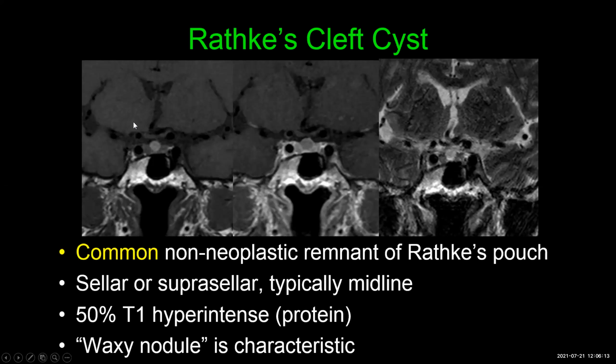This is a pre-contrast image. We might think that this is the posterior pituitary gland because it's this little bright spot, but we are actually more anterior than would be expected. This little round thing is sort of bright without contrast. If you just looked at this post-contrast image, you might think that this is a pituitary adenoma because it's enhancing less than the normal pituitary gland. You really need to check the pre-contrast image to see that this is not actually enhancement. There's just this bright signal that's living there in general. And this is a very typical T2 bright appearance of a cyst.